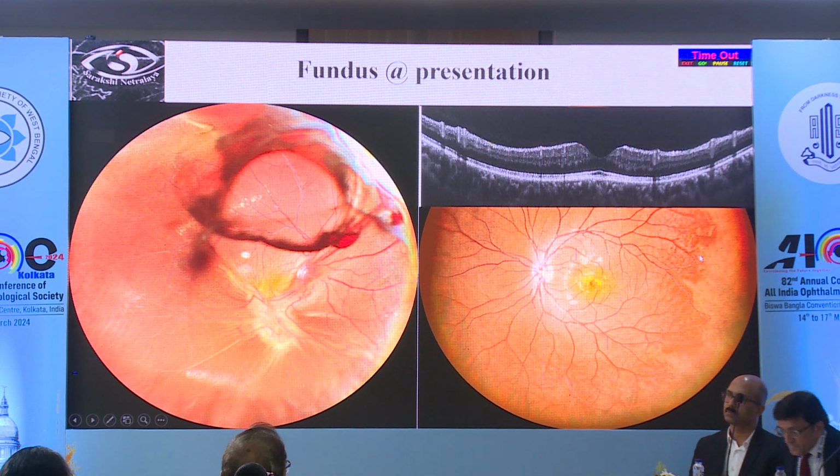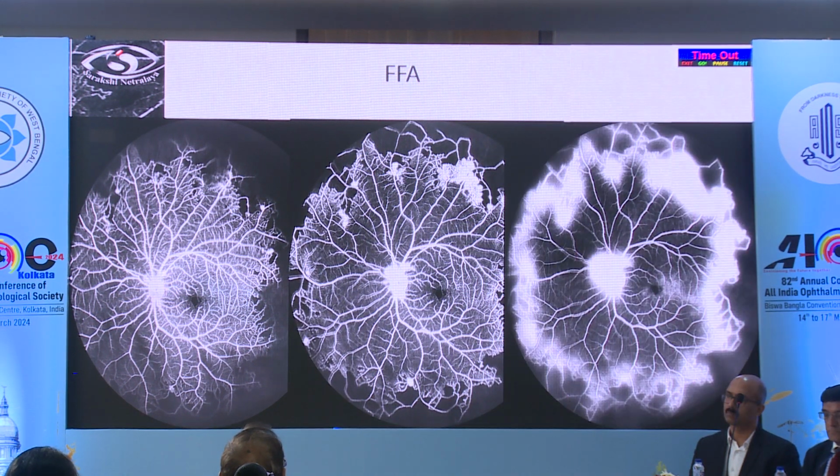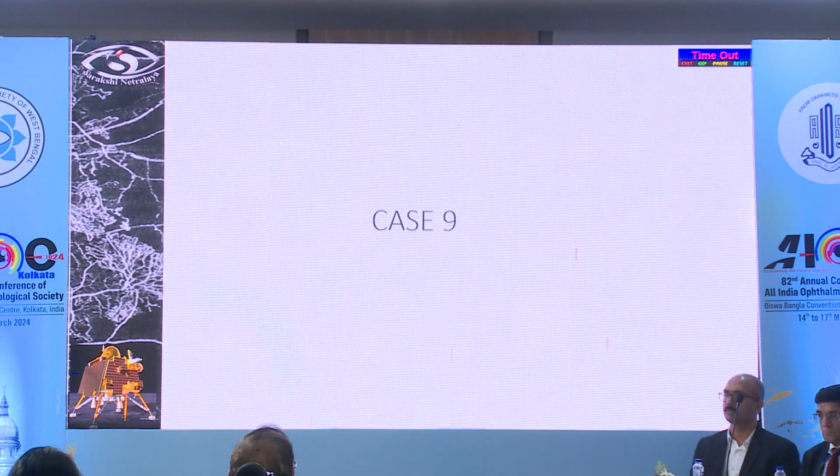When we did an angiogram for this particular patient and further systemically evaluated, this young girl had a Takayasu disease, so we treated the better eye before we touched the eye which was symptomatic. So this is how it changed my way of looking.